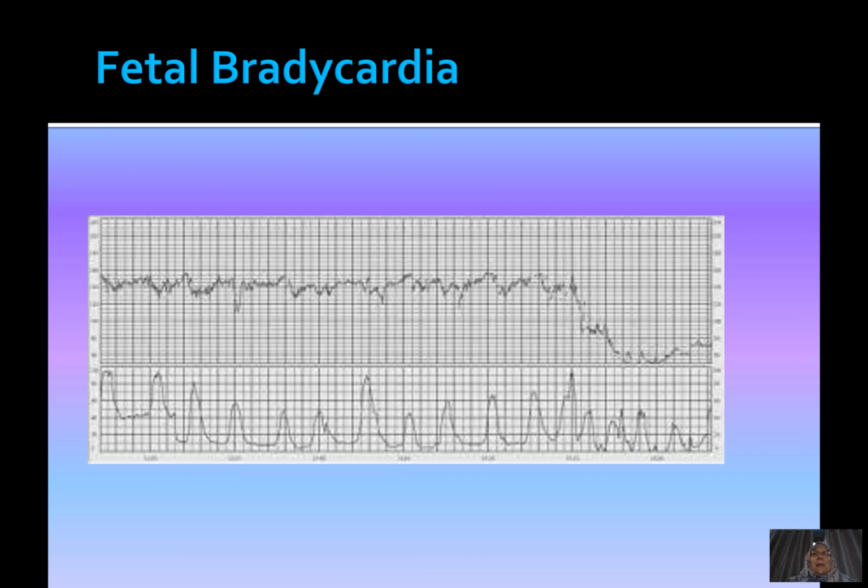So again, you can see a CTG here. Just take a minute to go through and write down the parameters of the CTG in a systematic way.